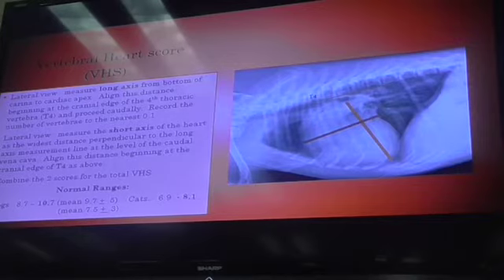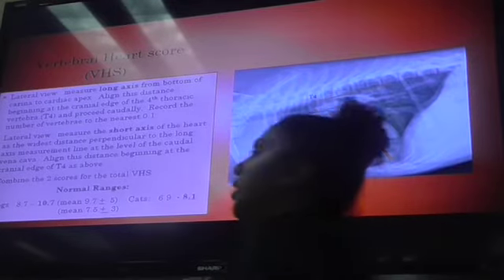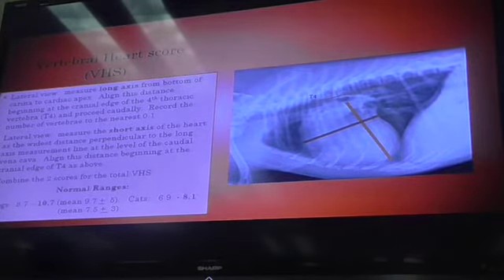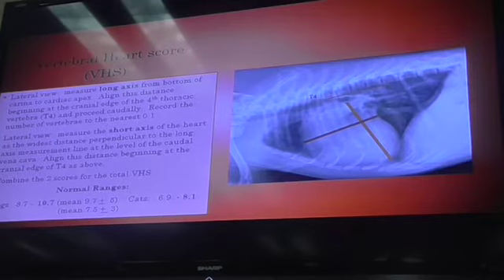Some of your digital viewers will have calipers on there for you. I don't really have the numbers to say whether it measures centimeters or millimeters for you. I just know the old school way, where we take a piece of paper, put this up, make a hash mark, count down, and go forth.